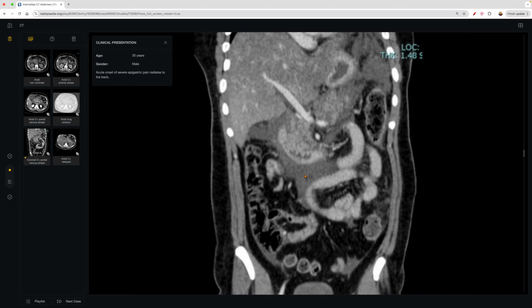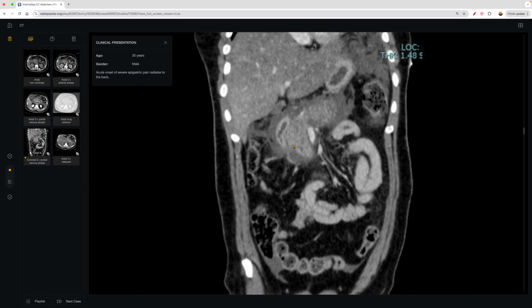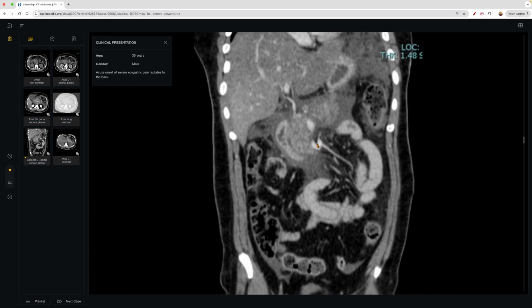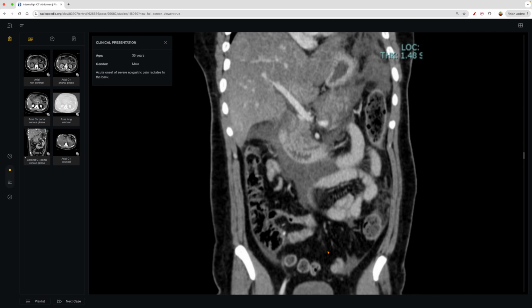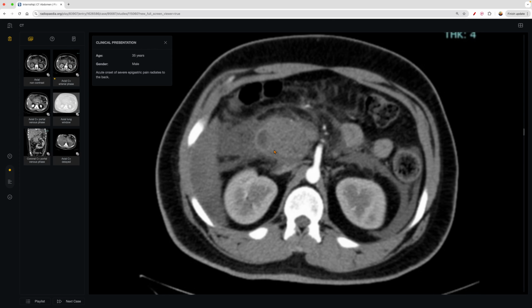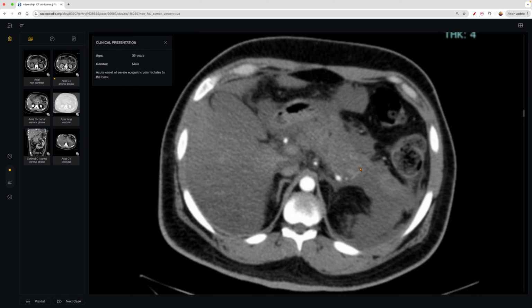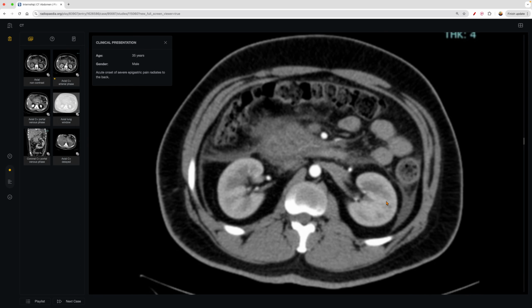And it's because there's this gray density within the abdomen, kind of surrounding the structures here, right? And so this is fluid, peripancreatic fluid, and this is due to the inflammation brought on by pancreatitis. Now you compare this to the mesentery and abdominal cavity, and you can tell that there's certainly something off. Again, I'll always say that this is the key to understanding radiology, is knowing the normal versus the abnormal. And so if we go to an axial view with contrast, you can actually see all that swelling and, of course, the inflammation and fluid accumulation as well.